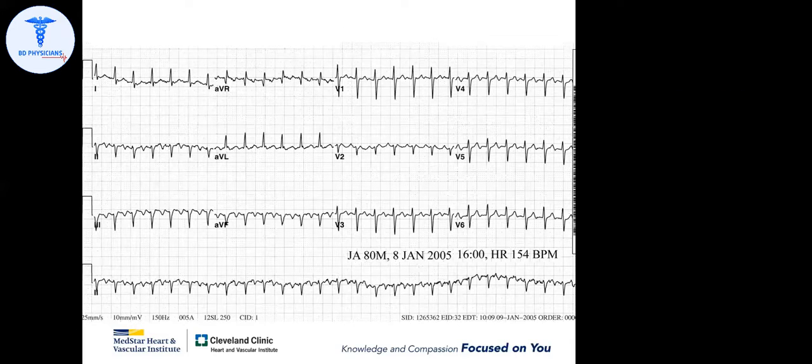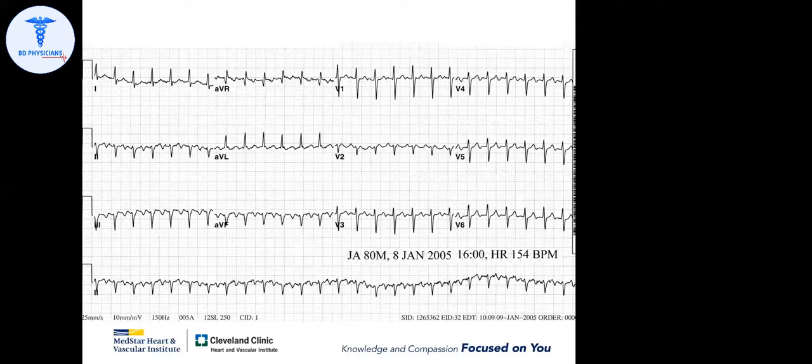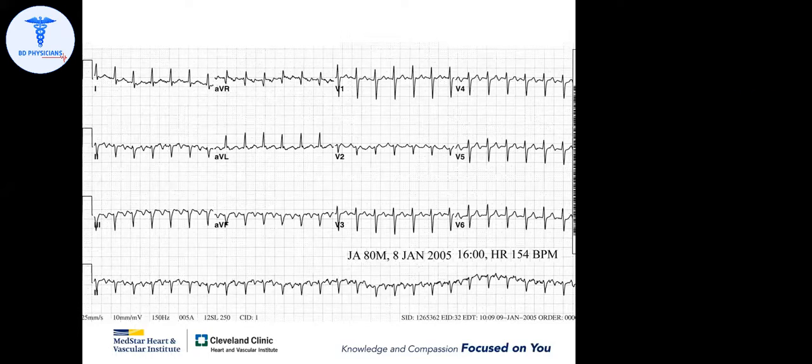Assalamu alaikum, sir. Who is this? Sir, Dr. Mahbuba. Okay, Mahbuba, please do this. I gave you the rate is 154 beats per minute. Yes, sir. Here, sir, rhythms are regular. Regular. So it is not atrial fibrillation, right? No, sir. No atrial fibrillation, no, sir.